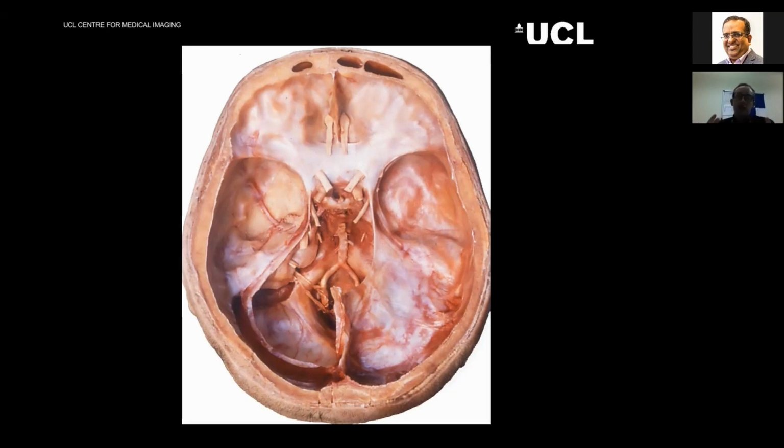If they're looking in the middle cranial fossa, you're starting to think about, okay, is this a parenchymal lesion or is this an extraaxial lesion? How do I differentiate? And in terms of the anterior cranial fossa, remember, you've got obviously the frontal lobes, but this is much more susceptible to trauma, for example, or infection that's coming from the frontal sinuses.